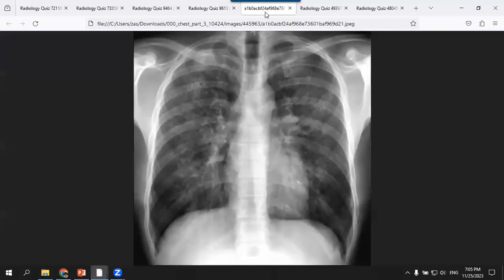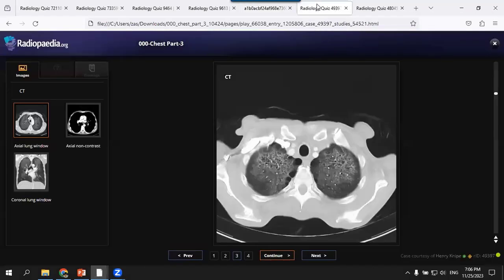Yes, mainly this infection. Okay, other types less likely. Very good. Because here, if you notice, my friend, the faint opacification involving mainly the central area. The peripheral chest is preserved with these subtle opacities, and some reticulation and minute cysts within. This is classic for pneumocystis pneumonia.